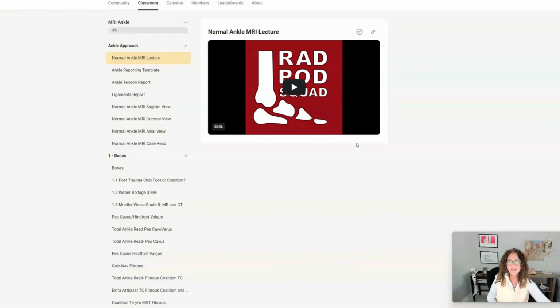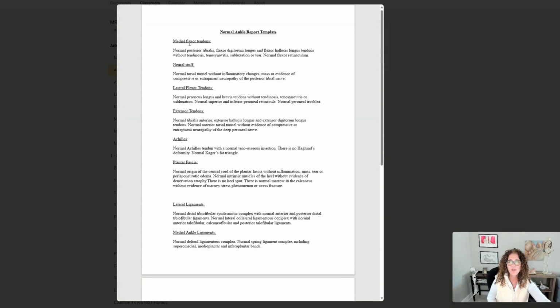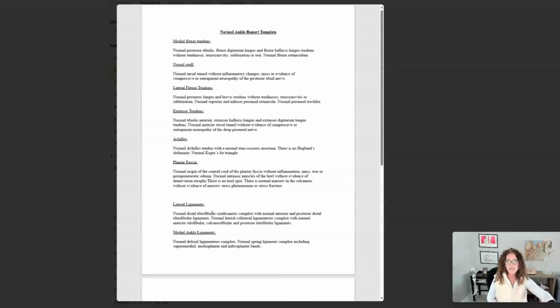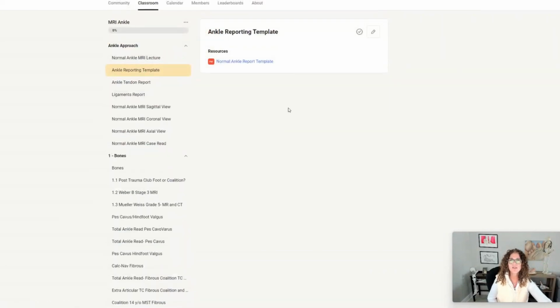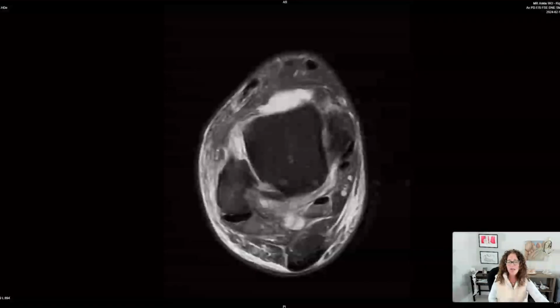I've got a whole video on how I evaluate it, but the money is really on this reporting template where you're going to go through all of these structures over and over again in a certain methodical way so that you're going to be able to come up with all the diagnoses just like I have. And I've broken that into different ways, and I can show you a variety of those. But let's just take a look at this particular case and apply our normal ankle report. I'll read the whole case for you so you get how I would approach it.